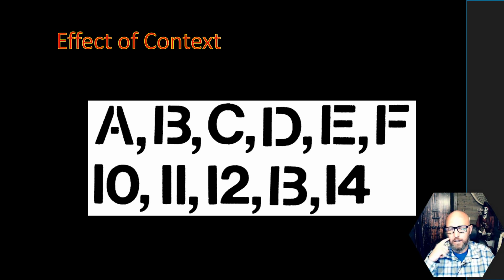But compared to the air, which is typically found in the sinuses, that same radiolucent component that might be filled with fluid is going to appear radiopaque. So it all depends on what's around it. This is an example of that.